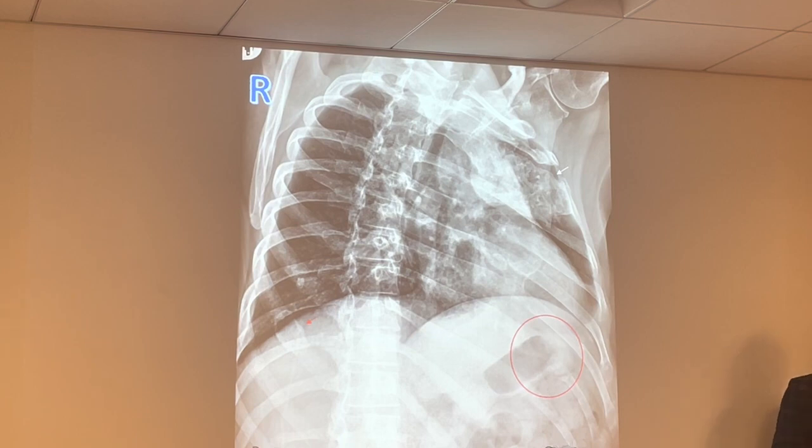Now, depending on what side's touching, that's going to elongate a certain portion of the ribs. If my right anterior surface is touching, it elongates the left. If my right posterior side's touching, I'm elongating the right. It's going from posterior obliques to anterior obliques. It's how you can deduce what we're looking at on a radiograph.